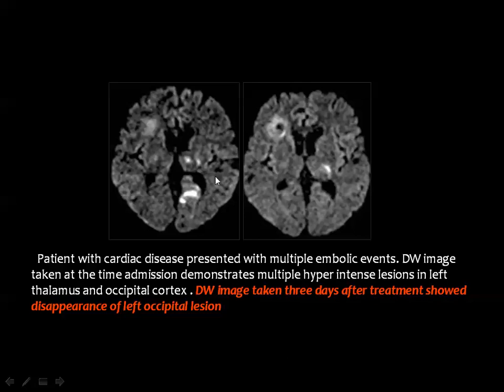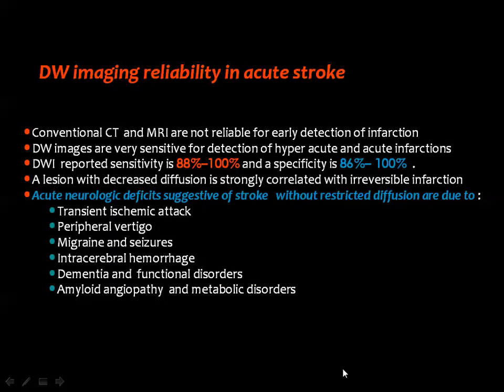And this is the diffusion weighted image, and this is the follow-up after 3 days, and you get reversibility of this lesion. The lesion appeared here, and after 3 days it is not shown, meaning that it has been reversed.